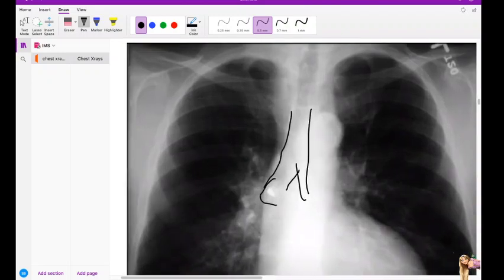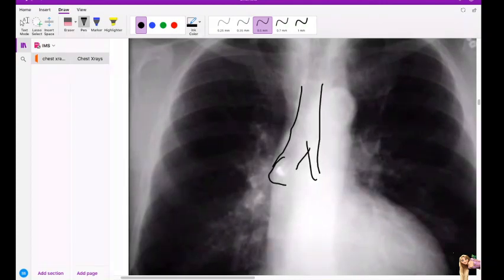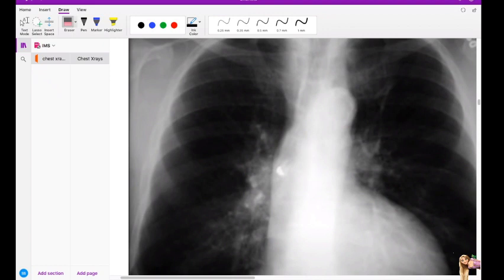I'm going to just zoom in more. I don't think it's very visible. Is it visible? It's a tooth, actually. It's not a ring. It looks like a tooth. It's an adult X-ray. Adults won't usually take in foreign objects, I guess. But teeth can go.